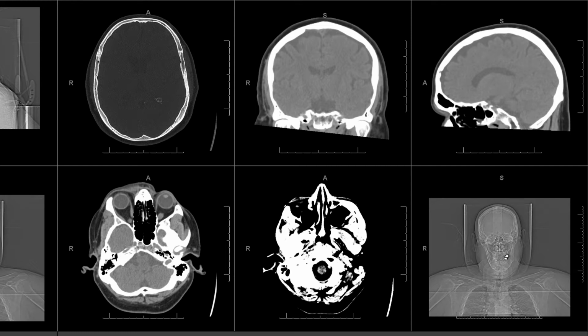Review any image or series of images in a stepwise fashion. It doesn't matter what pattern you use, as long as you're using the same pattern every time. And again, you don't have to use my approach, but you have to use an approach. This will increase your sensitivity to any abnormalities.